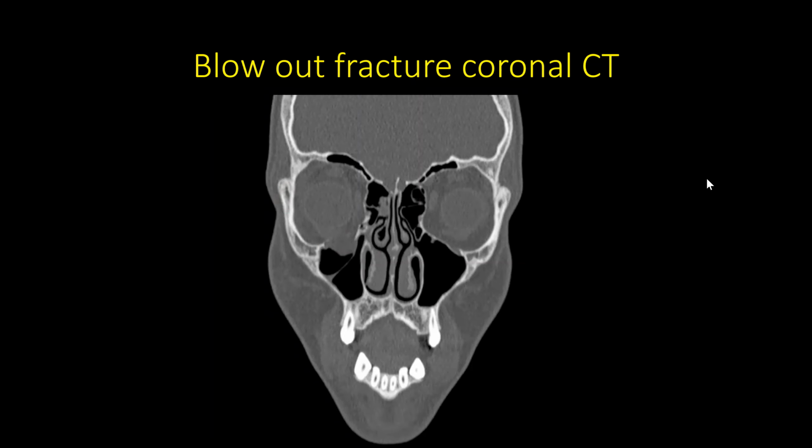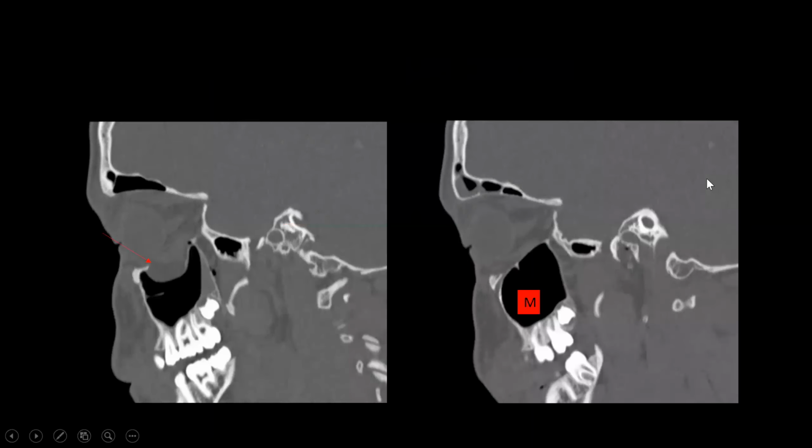Next, this is the same patient. Continuation of the previous.